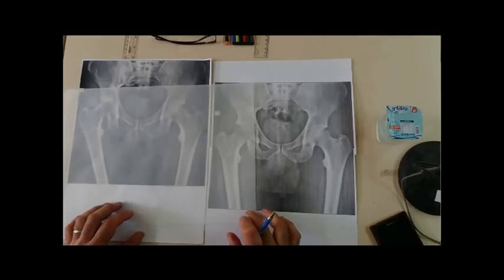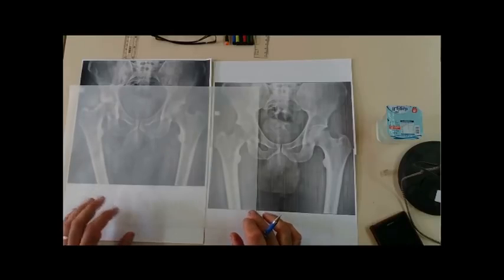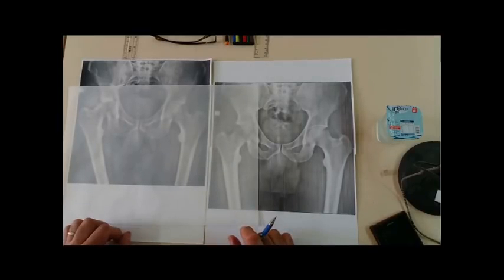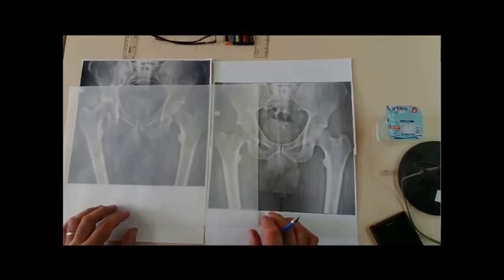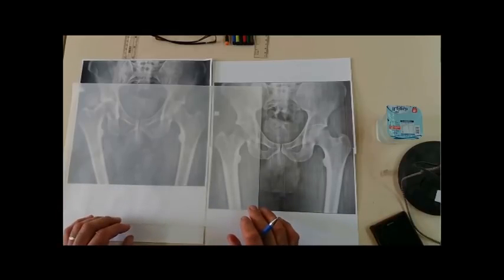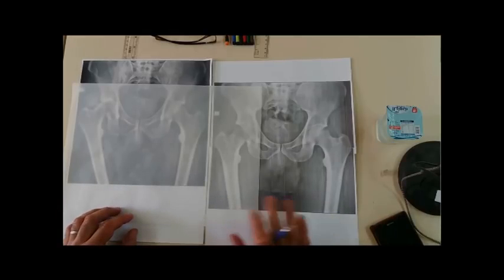This video is designed to complete what has been mentioned in the workshops in College of Medicine and Nahrain University regarding preoperative planning for total hip replacements. In this video we will try our best to explain what templating is. Templating is one part of planning, it is not the whole part of planning for total hip replacement.